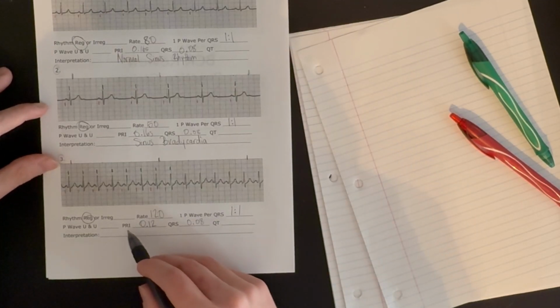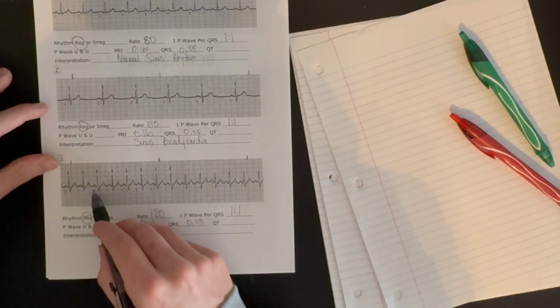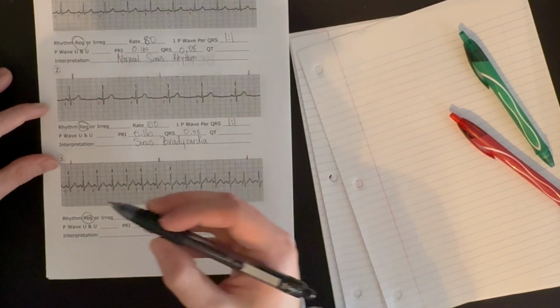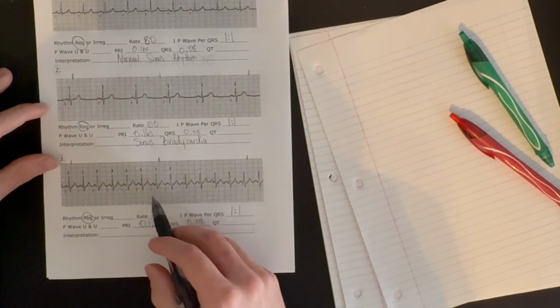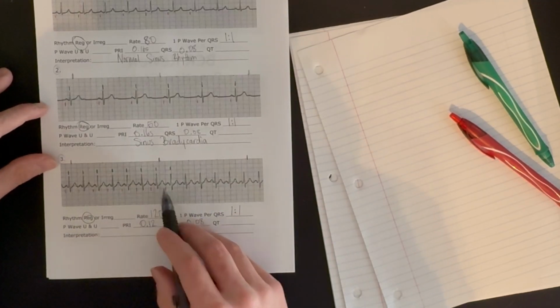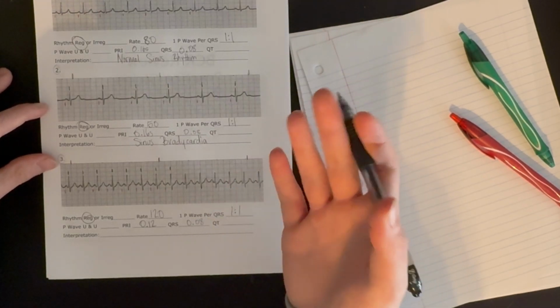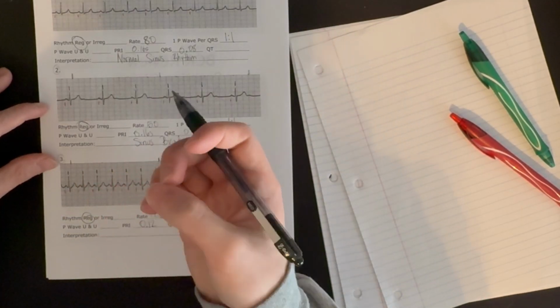And then our PR interval is in the normal range of 0.12 seconds, and it's consistently 0.12 seconds, which means there's no blockage of the signal as it gets from the atria through the AV node to the QRS complex. The only abnormality here is our high rate of 120. So what do we have here? We have sinus tachycardia, a tachycardic rhythm of above 100 beats per minute that's still originating from the sinoatrial node.